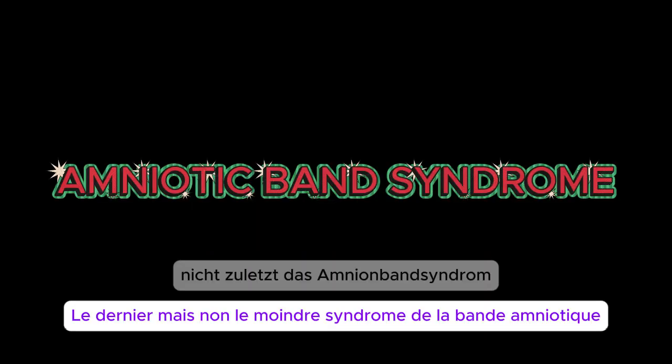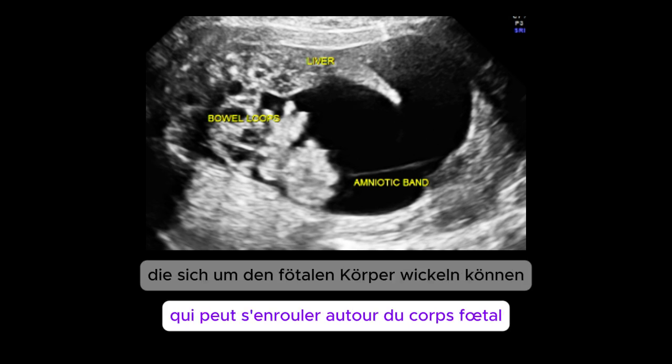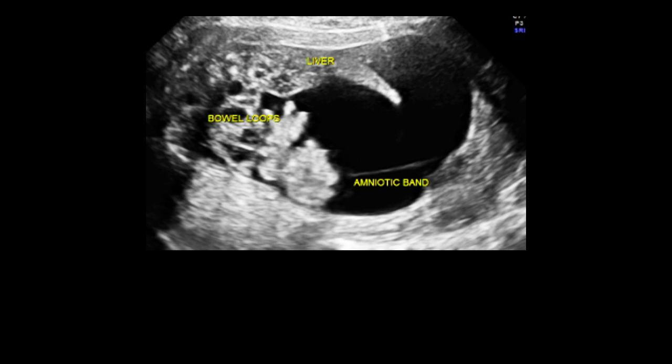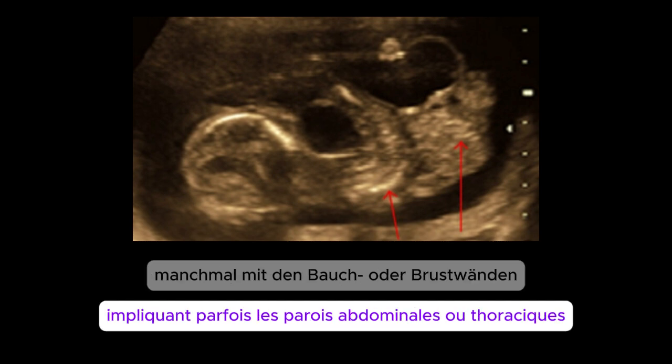Last but not least, amniotic band syndrome. Rupture of the amniotic membrane can result in amniotic bands, which may wrap around the fetal body, causing wall defects by constriction, as well as limb amputations and other abnormalities. Amniotic band syndrome can affect any fetal area, sometimes involving the abdominal or thoracic walls.